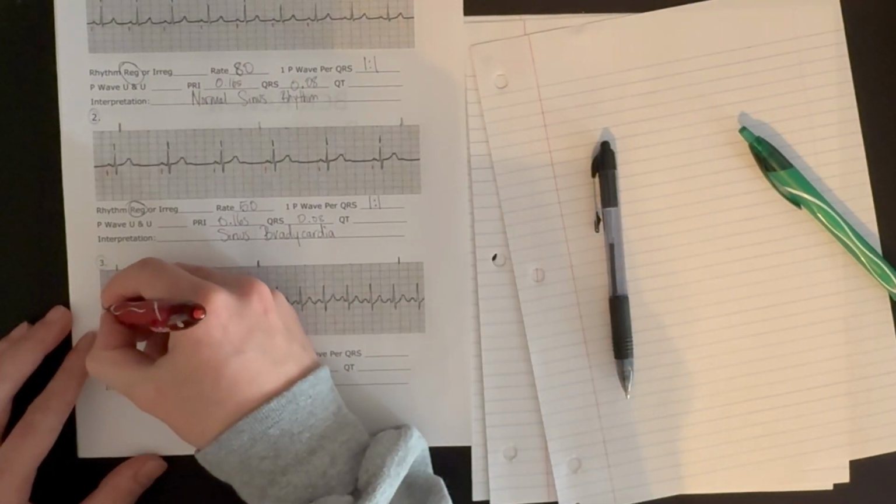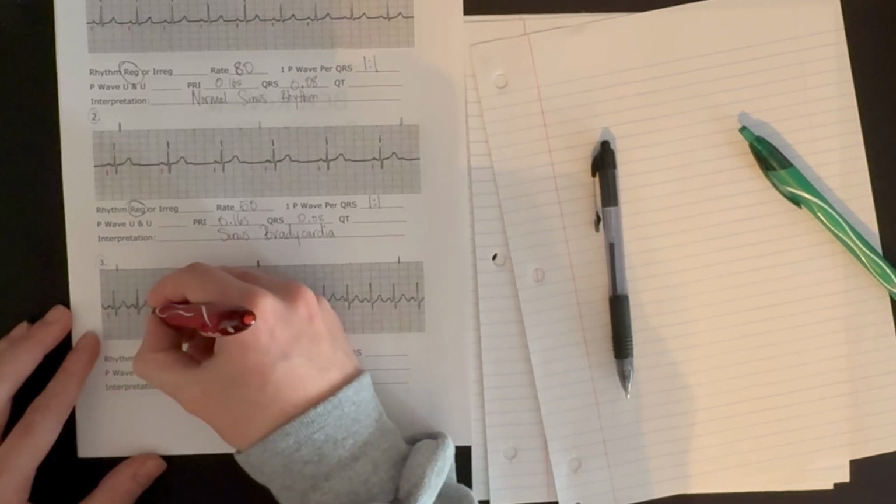How's our rhythm? Well, let's start here. P wave, P wave, P wave.